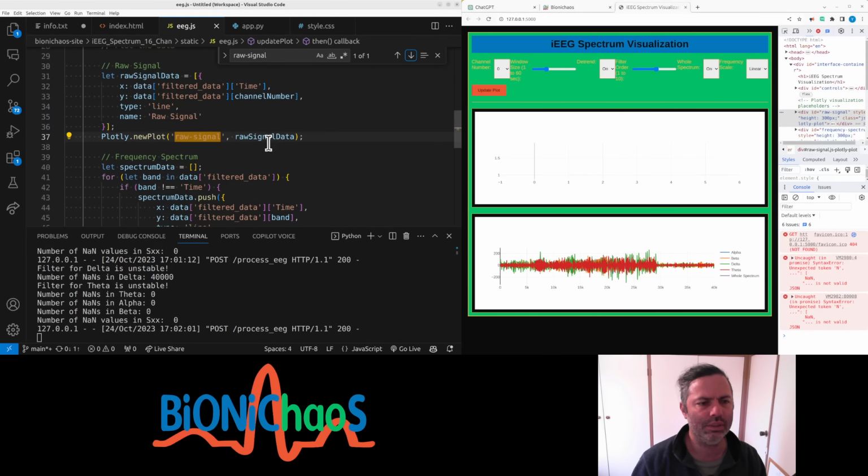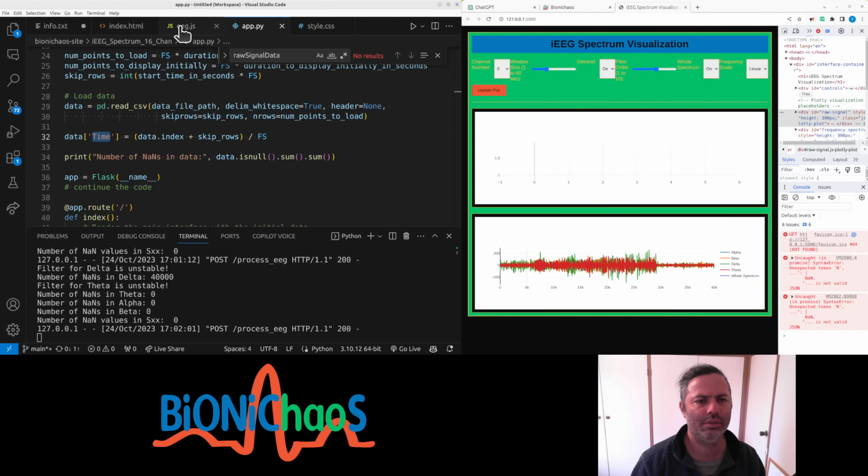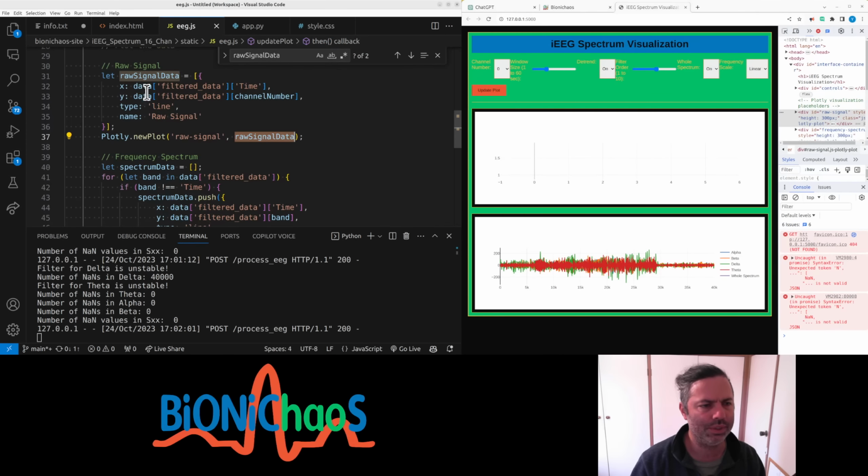Raw signal data. No, raw signal data, filter data, time.